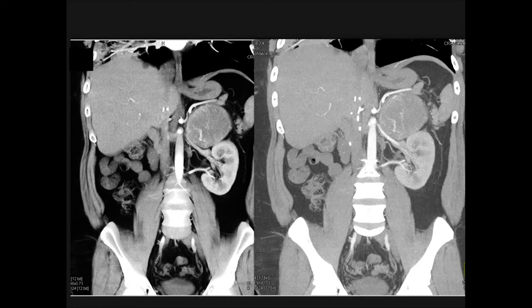Now, if you look at this mass, and forgetting everything, if you only had the adrenal circled in, it could be a pheo. It's a large mass, some vascularity, could be a primary carcinoma. Lymphoma is usually bilateral, and usually not very vascular, but I couldn't exclude it. And in theory, it could be metastatic renal cell carcinoma, right? Because it's a solid mass, and any mass can be metastasis.